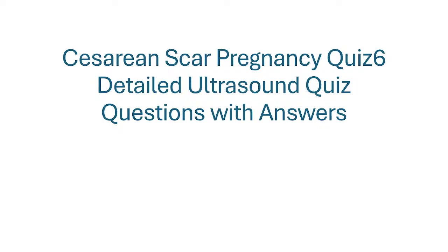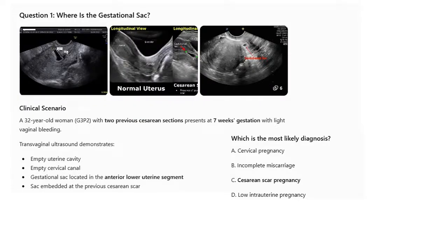So question number 1, where is the gestational sac? You can see there.